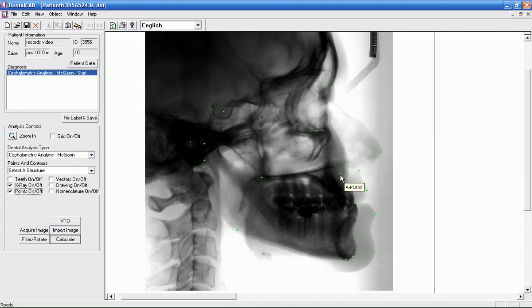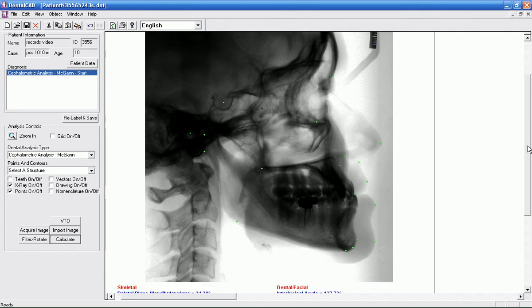And here's a point which I carefully moved. Well, let's see. Maybe I should leave that one alone. Maybe I should take B point. B point looks good enough. Looks like that's a little easier to place back in the same place. So I'll put B point up here on one of these lines. Remember, it's the white dot.